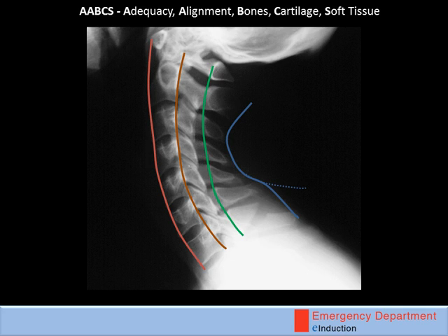As we work our way through the bones, the vertebral bodies all seem normal, in size and in shape. And there seems to be no problem with the facet joints all stacking on top of each other. However, as you go over the spinous processes, you've worked your way all the way down to C7, you'll see something a little bit unusual. This is the fracture, and it's called a Clay-Shoveler's fracture.